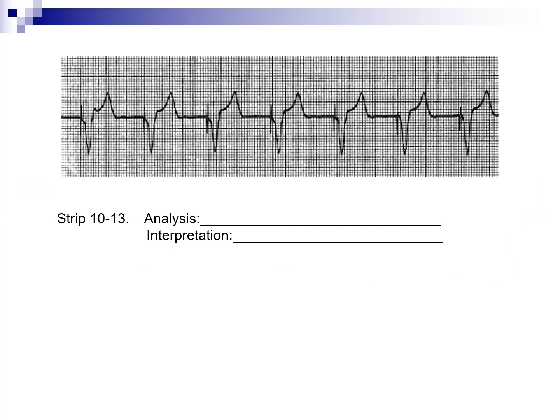In 10.13, we have 100% ventricular pacing. That's normal pacing. So you have 100% capture, so every pacer spike has a QRS that follows. The rate of this pacer, again, you would measure from pacer spike to pacer spike. You probably can do R to R as well, but for the most part, this rate would be the same, and it is 60. So this pacer is set at 60. Now, we see that it's capturing appropriately.